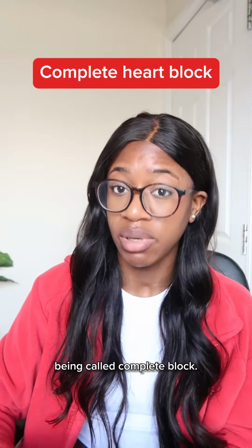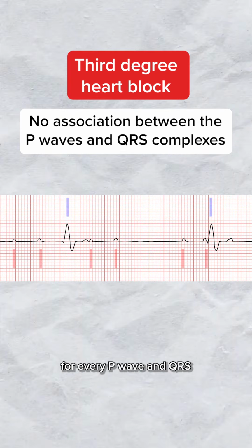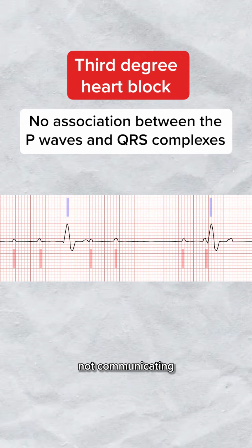You might hear this being called complete heart block. This is because there's no association between the P waves and the QRSs. If you drew a line for every P wave and QRS, there's going to be no link between the two. They're going to be regularly spaced out, or sometimes the QRS might obscure a P wave because they're not communicating with each other.